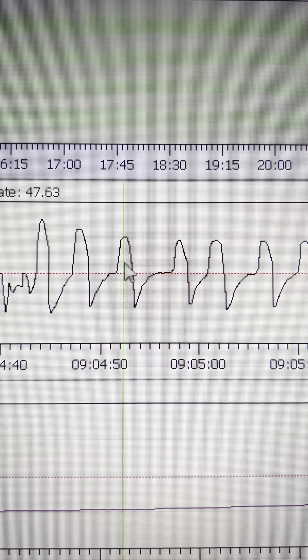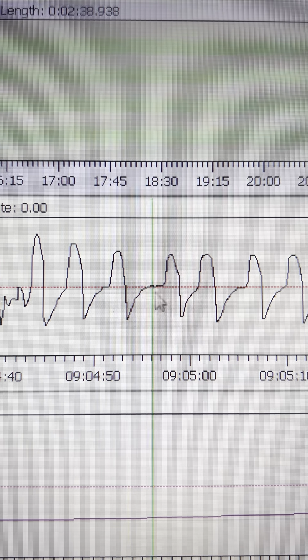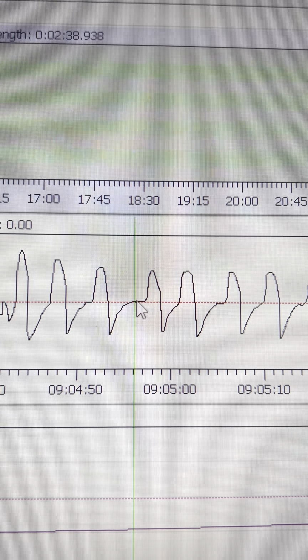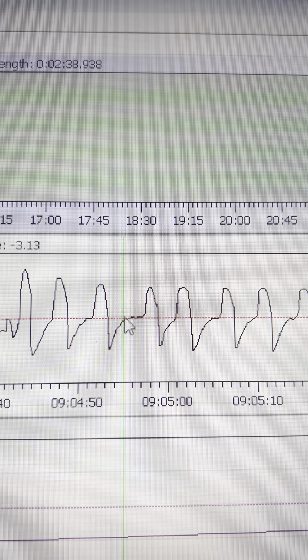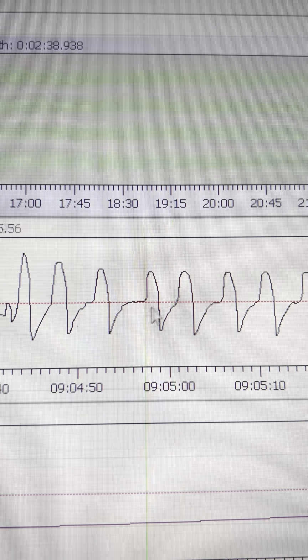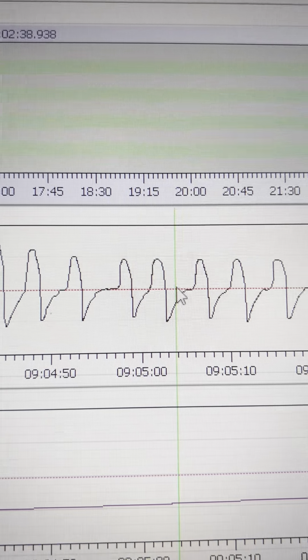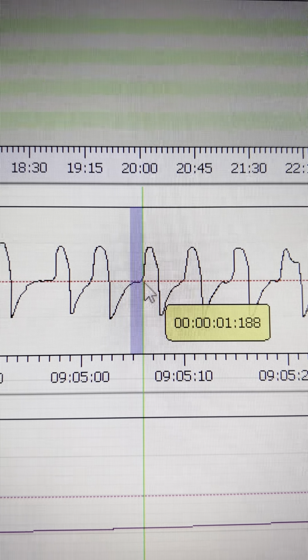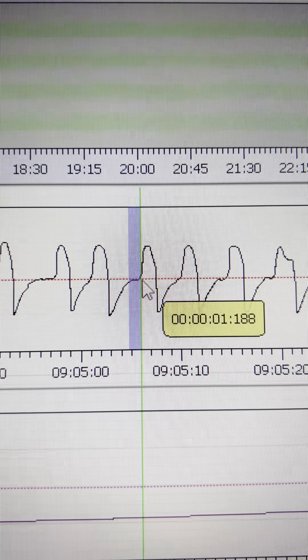For me, that's only like a little bit. You can see that I'm breathing in. This right here is probably not obstruction, it's probably more central. You can see that it's like, how many seconds? 3 seconds almost. So 3 seconds, then I have a normal breath. Here it tries to stabilize probably again. And then the central breaths lessen to 1 second.